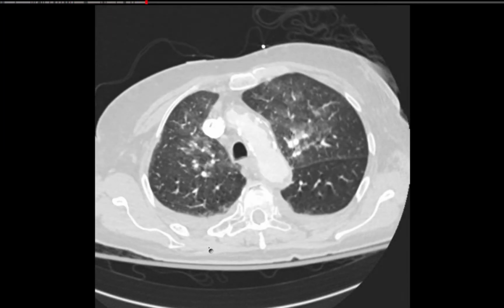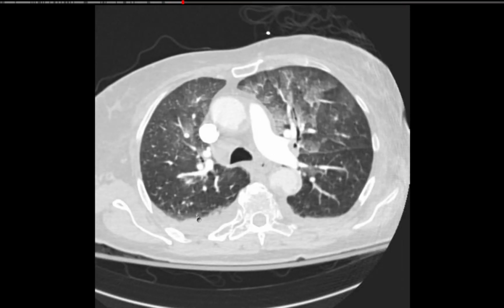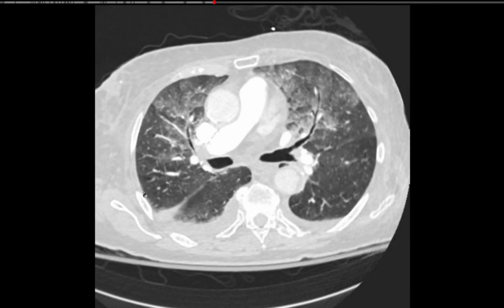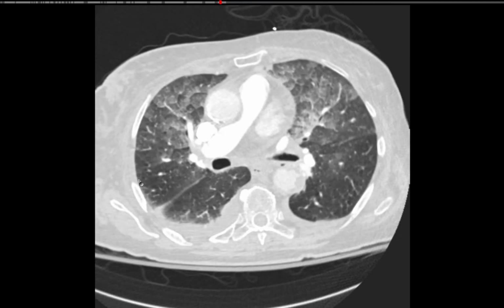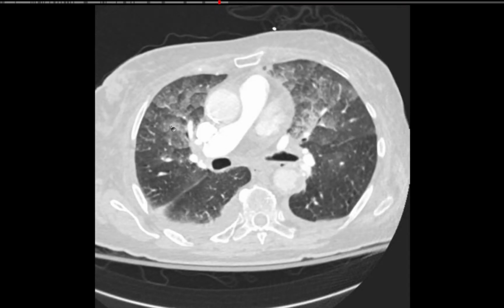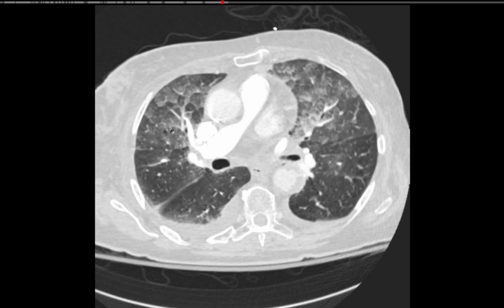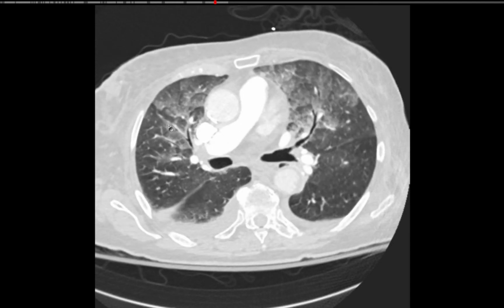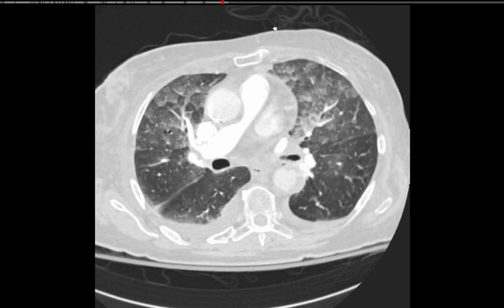When I look at the appearance and the distribution of the lung water in the anterior lungs, I think I'm seeing the so-called intralobular gradient, where in relation to some pulmonary lobules, the water is accumulating with the patient recumbent in the more dependent alveoli within some of the pulmonary lobules. Now, Jeff showed a case just like this, I think a couple of weeks ago, and it was reported initially, or at least one report in the context of re-expansion lung edema. But if you buy this, this is a case in more ordinary lung edema.